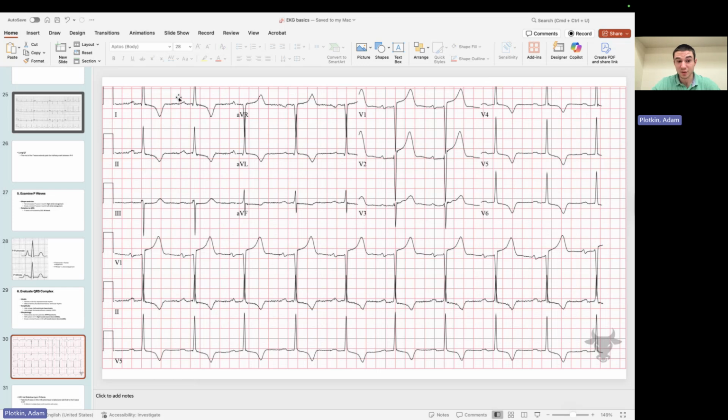So, this patient might have eventually some left axis deviation, but again, we could use my lead 2 as the tiebreaker, and lead 2 is up. So I would lean more towards this being normal axis. Okay. The QRSs look nice and narrow. Okay. But the problem here is when you look at leads V5 and V6, right, which pick up the left side of my heart, these are quite tall R waves. Okay. And there's a number of different criteria to diagnose left ventricular hypertrophy.